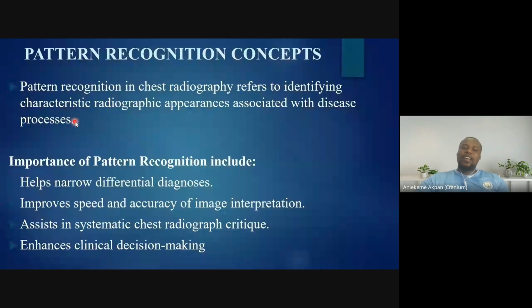And then somebody now asks that the chest X-ray I'm sharing looks the same, there's not much difference. So if there is a systematic approach, in a case of maybe another finding, an incidental finding that probably the doctor is not even worried about, then the radiologist is going to pick it, right? So it's not only for you to, maybe the doctor is now querying pleural effusion, and then you look, there's no pleural effusion, you send the patient back.